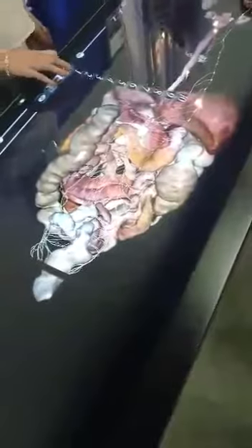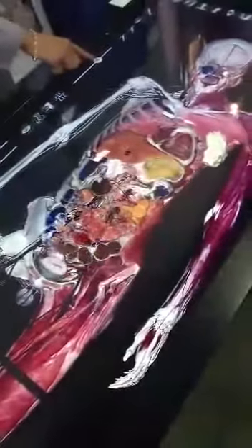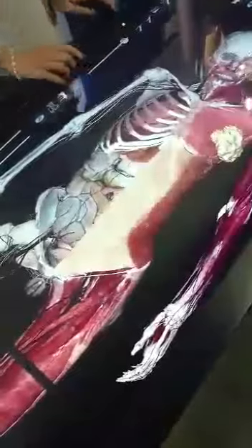This is amazing. And in this case, you can also have concurrent views of, let's say, the muscular system and the skeletal system, and also start removing different areas to see regional anatomy and other types of anatomy as well at the same time. If you don't want to look at the anatomy as a whole, you can also see regional anatomy. So in this case, I have the female head and neck.